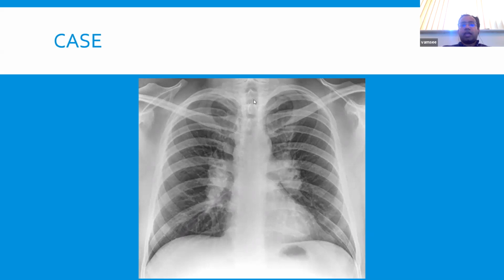But airway central. Now, when you come to the lung fields, the thing that stands out quite significantly, you've got the hila, which are completely out of proportion to what we normally see. So this is bilateral hilar lymphadenopathy, exactly as Ali mentioned. Bones, they don't seem to have any fractures or any abnormalities, and both diaphragms with costophrenic angles and cardiophrenic angles appear clear. Yeah, so fine. The most notable abnormality here is a bilateral hilar lymphadenopathy.